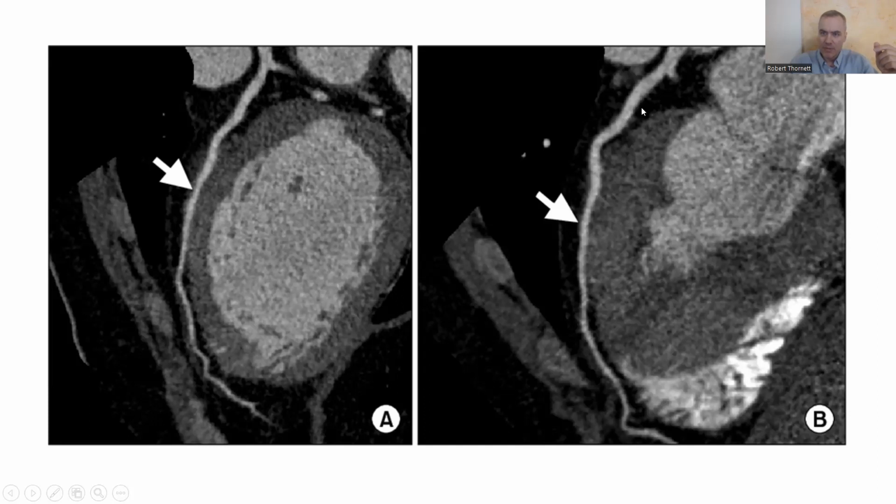Here's the artery, and they're supposed to be black like this all the way down, between the heart and the artery. There's supposed to be black stuff between them, just like you see at this part down here, a buffer, because the artery is just hanging out, sitting in all this fat around it in your chest cavity.